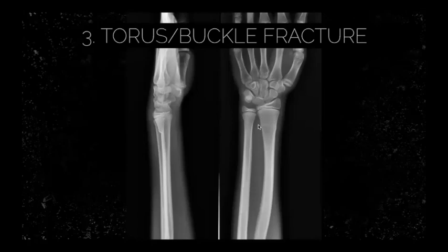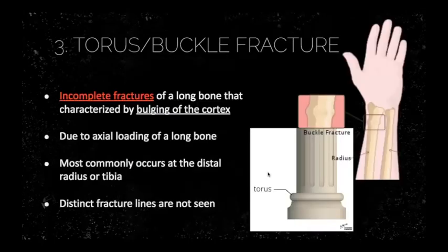Again, an example of a buckle fracture. On the AP view, we can see there's a bump there, but we can also see some sclerosis here, and on the lateral view, we can see that one of the cortices has already a cortical break at this region. Right, so we can call this a torus fracture or greenstick fracture. Right, torus is an incomplete fracture.